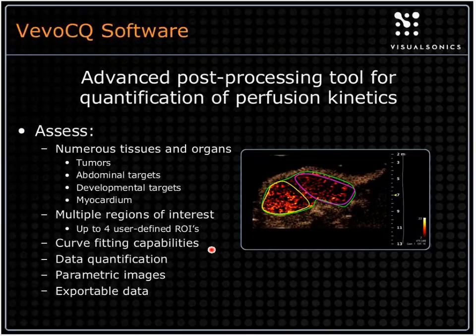Once you do the perfusion analysis, you do curve fitting, so the software will take those nonlinear data and fit the signal from the nonlinear contrast to curve algorithms. It generates parametric images for you, so we've got a little visual example here. We'll have lots more later on.